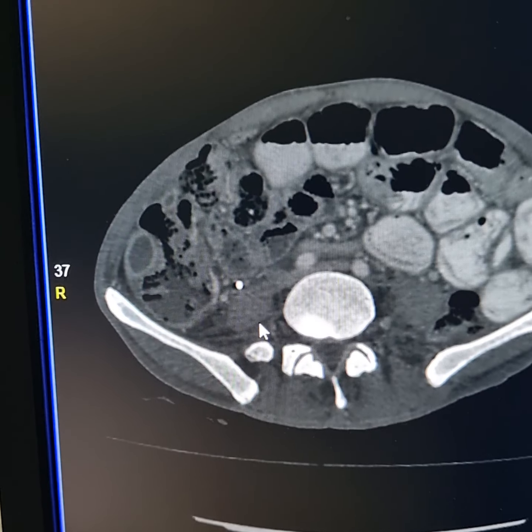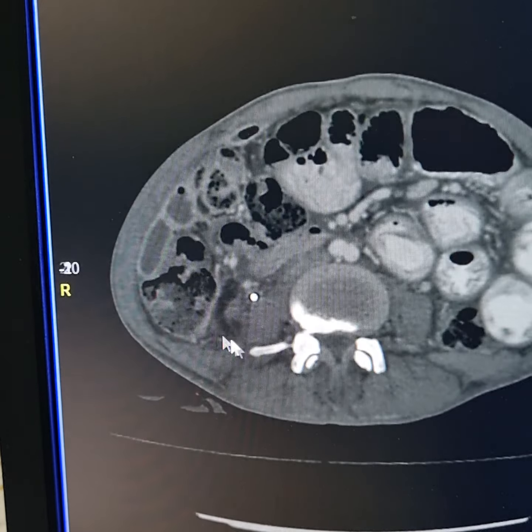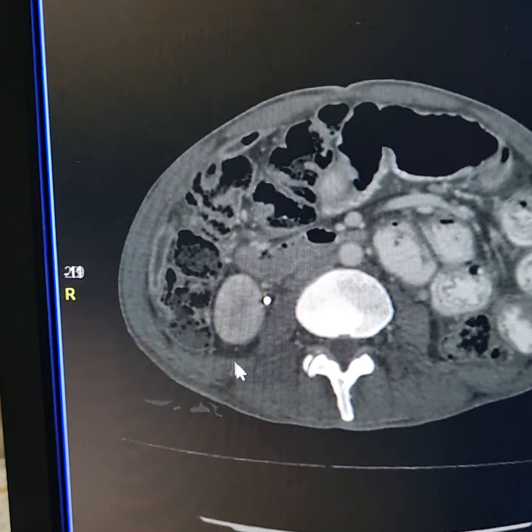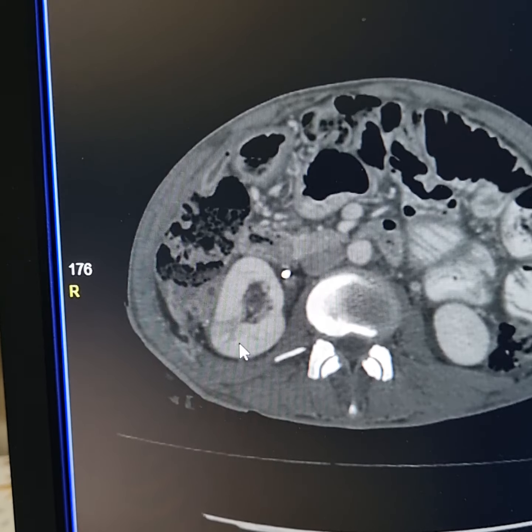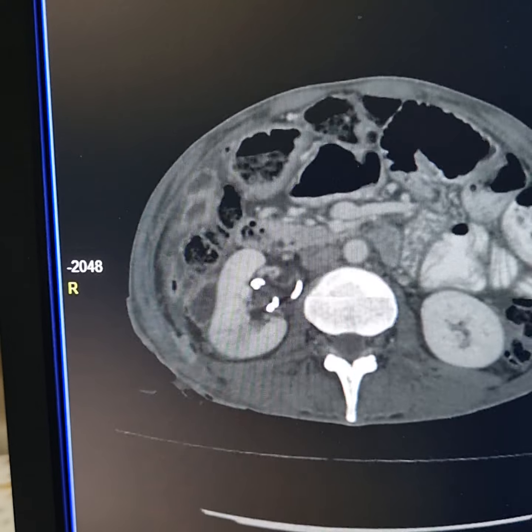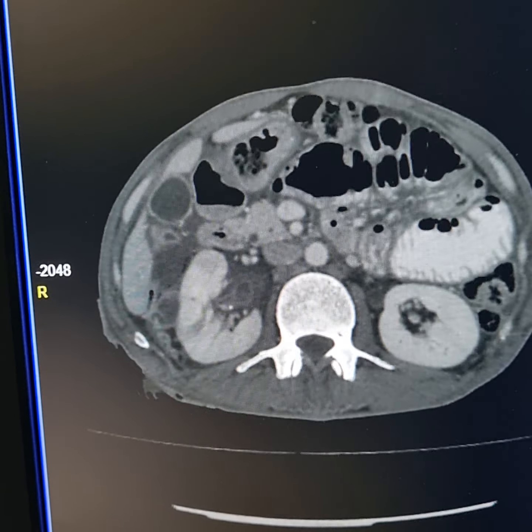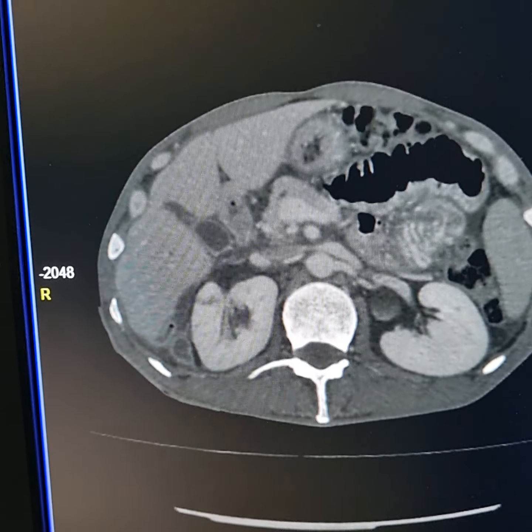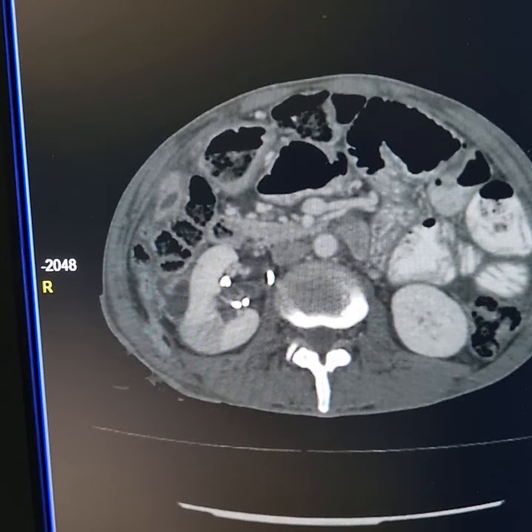As per the surgical notes, it was mentioned that there was trauma to the ascending colon during the surgery. Now it is always wise and mandatory to describe the location of the ascending colon as well as the descending colon while commenting upon CT IVUs or plain CT KUBs.